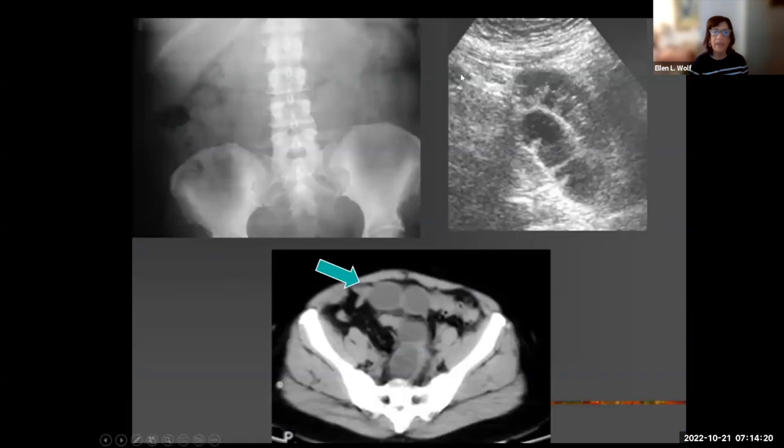So this is a patient that came in with abdominal pain and vomiting, and was suspected of having small bowel obstruction. They did this plain film, which was read as normal, which I think most people would agree. We don't see any signs of dilated small bowel, air-filled small bowel. There certainly isn't a paucity of gas and stool in the colon. This was called normal. So can you still have small bowel obstruction?